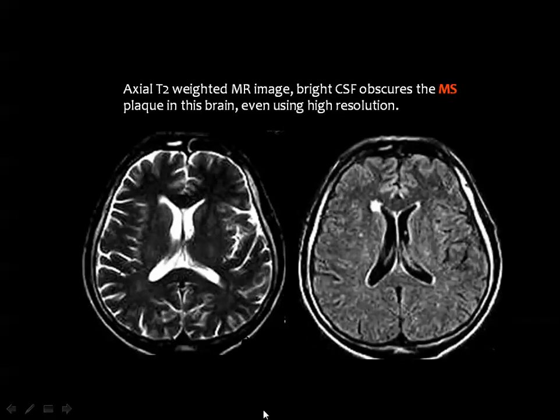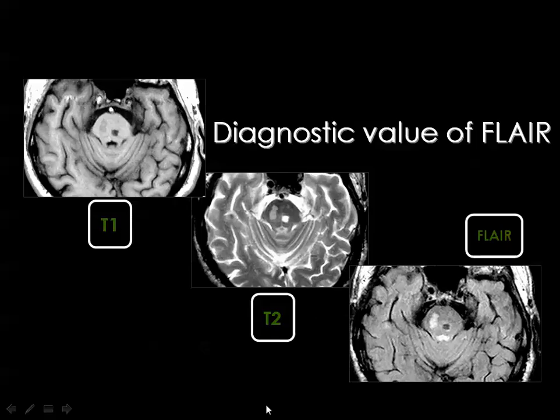This lesion will appear in the T1 black, similar to the CSF, and in the T2 it will appear bright, similar to the CSF. But in the FLAIR images, FLAIR means that there is attenuation of the fluid signal, and it is a T2 weighted image where the CSF is black. Then the lesion is bright and the CSF is black. Then you have the chance for adequate visualization of this lesion compared to this T2 weighted image.